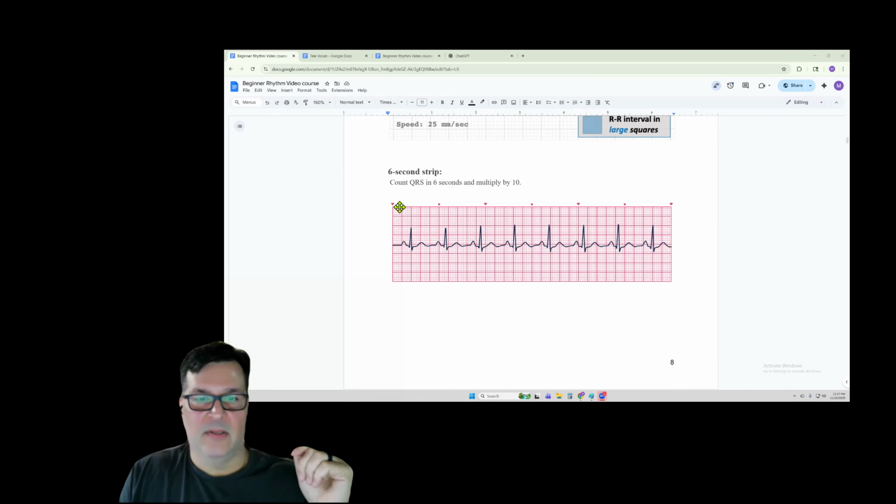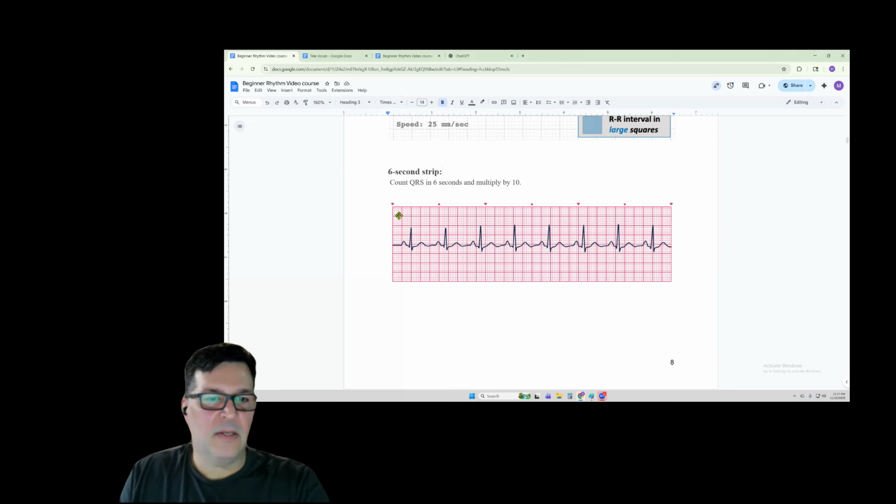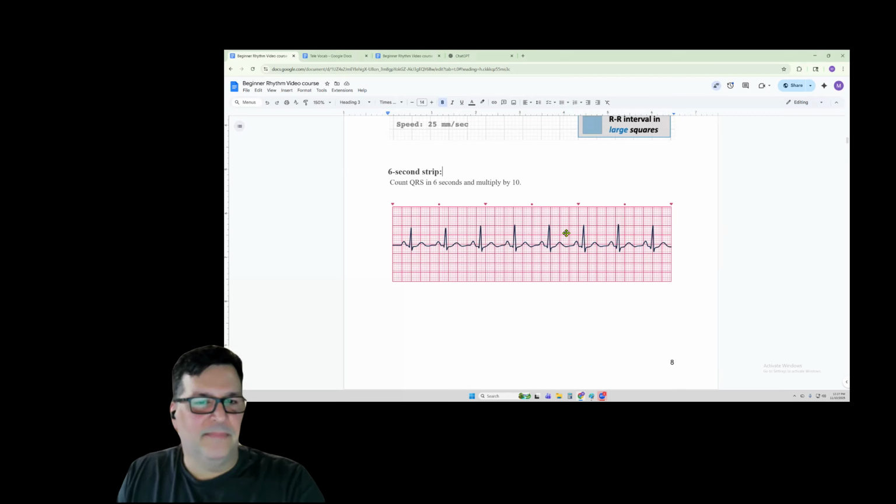And what you have on the screen is little black markers that give you 3 seconds. Right here, 3 seconds starts here to here. And this whole strip is 6 seconds. If you count it out, there'd be 30 boxes on here, because it's 5, 10, 15, 20, 25, 30. I can't do math. So 30. Yeah, that's right. 1, 2, 3 seconds. There's 6 seconds. All right.